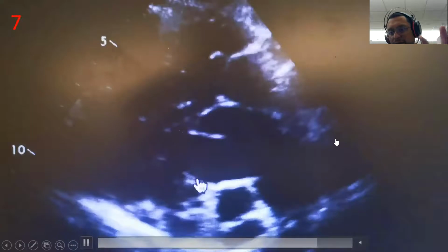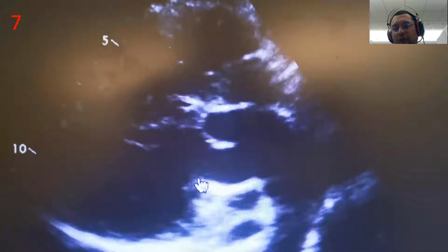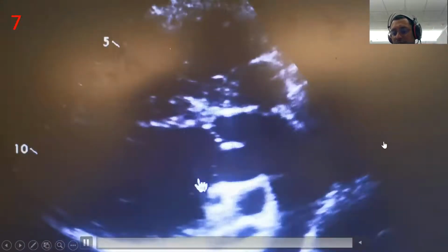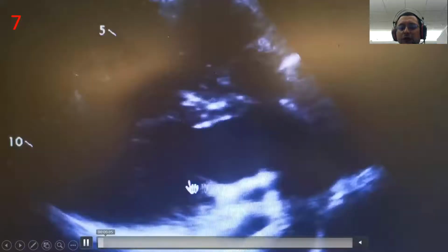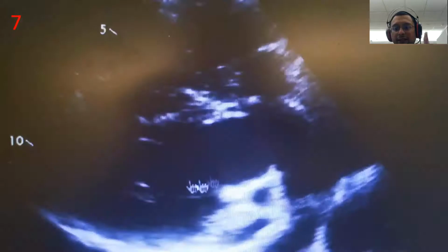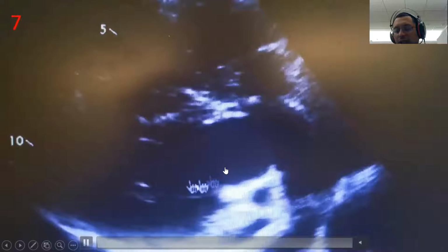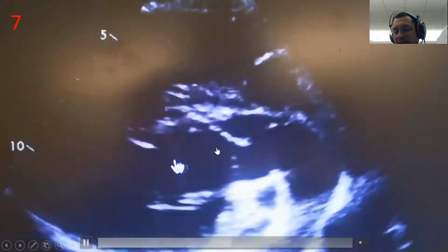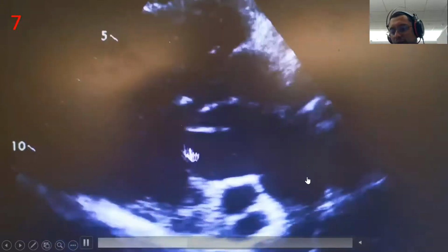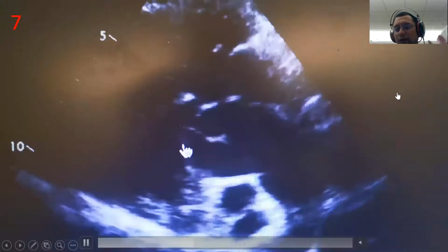So the left atrium is still connected to the left ventricle, right atrium still connected to the right ventricle. So you have AV concordance. However, in this patient, you have VA discordant. Okay, so this is the transposition of great artery. In parasternal long axis view, the way to differentiate DTGA and LTGA is in DTGA, there's still a preservation of the continuity between the mitral valve leaflet and the semilunar valve. In DTGA, you will see a pulmonary valve go down and bifurcate. In LTGA, this is still aorta, so it won't come down and bifurcate. This is in long axis view.